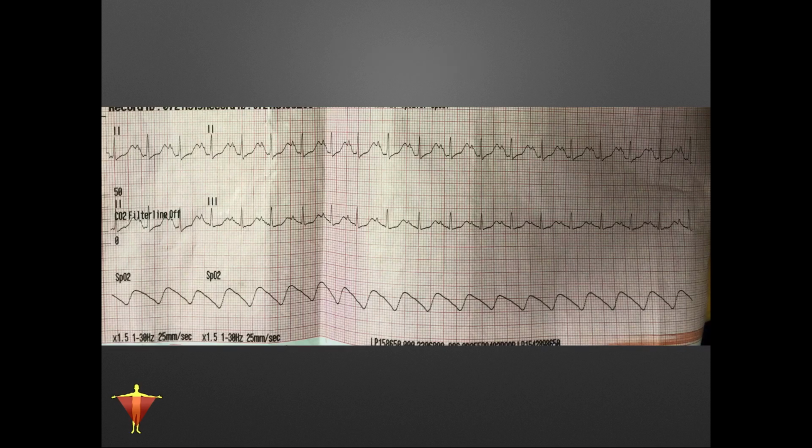All right, cool. So let's look at this strip here. So let's identify some P waves. Can we see P waves here? They're a little bit harder to identify, but what we can see is that right up in here, we have a small little P wave. Comes before every QRS complex, right? QRS, QRS, QRS. So we see P waves, we have a QRS complex. We see that it seems a little bit fast, right? Because we just have a really regular rhythm that's traveling through here. So what is it that we're seeing?